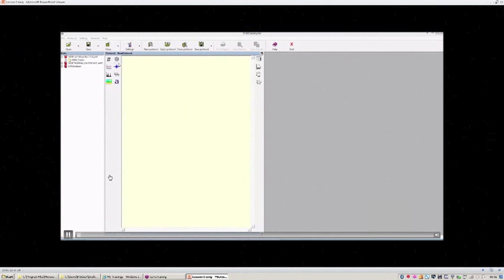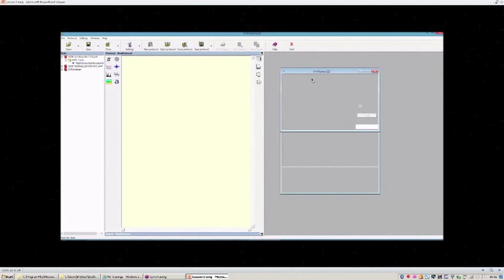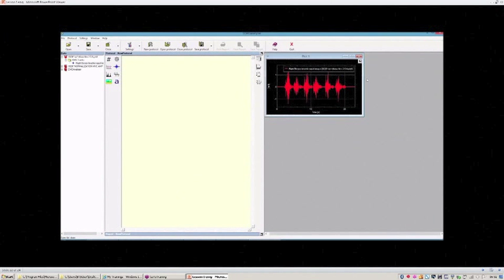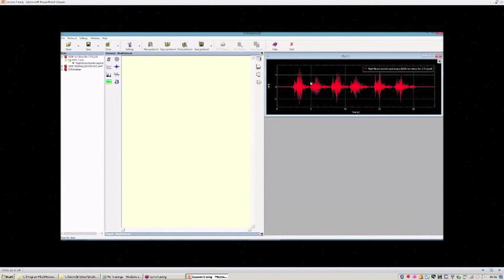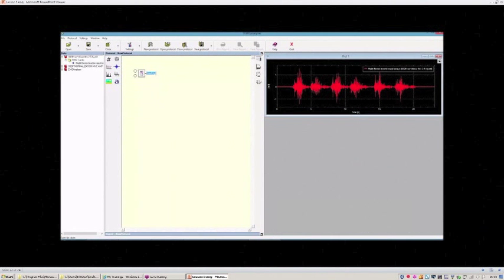Okay. So this is the example about how to perform the amplitude normalization of the signal. This is the EMG signal that we want to normalize and analyze. We can start with the computation of the root mean square of the signal to compute the envelope.